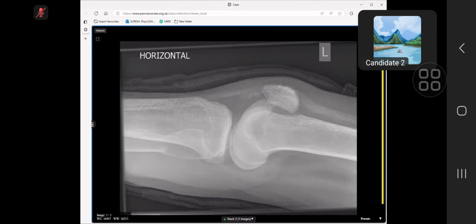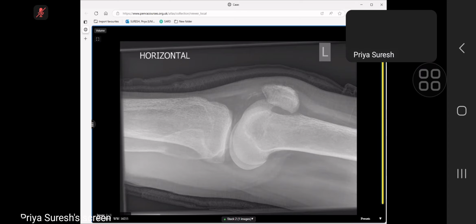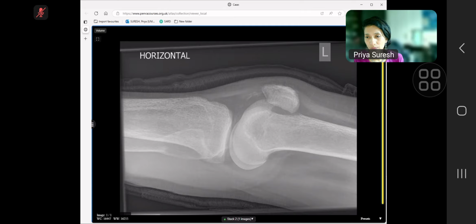There are also some patellar osteophytes in its lower extent. So I would like to check the record if the patient is a known case of chronic kidney disease or any other disease which has led to this degenerative appearance. If not, then it can be due to long-term disuse atrophy. So I will proceed next with the MRI for this patient to characterize the lesion further.